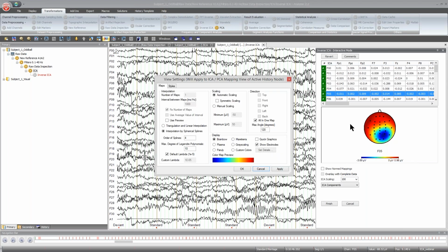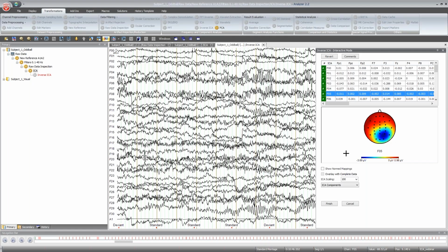So you cannot change it to a different view like the 3D mapping view. It has to be the 2D mapping view, but I can also say, okay, I rather want to see the front or the back. You can also change the color scales and the scaling. So it's the usual options that you have to customize your plots.